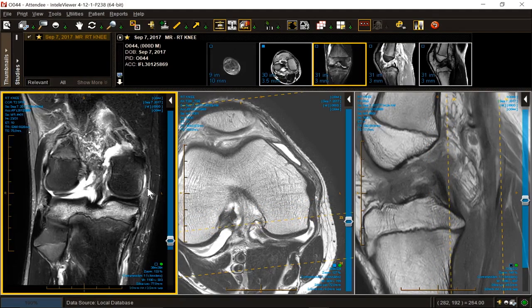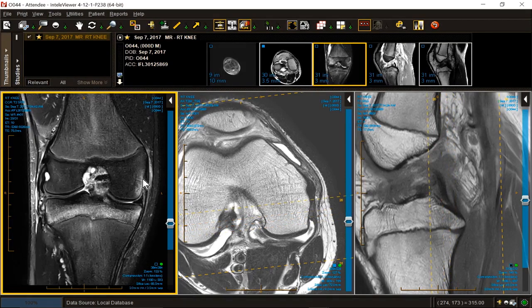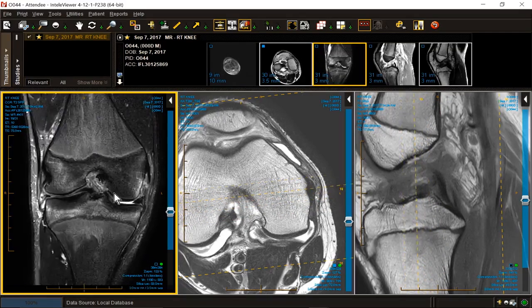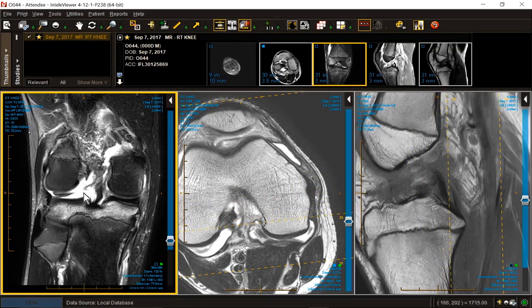This is called the POL right here, the posterior oblique ligament, part of the posteromedial corner. This little thing right here, it's intact. A little fluid underneath it. A little bone swelling underneath it. And then our bucket handle tear. Let's go to the back of the knee.